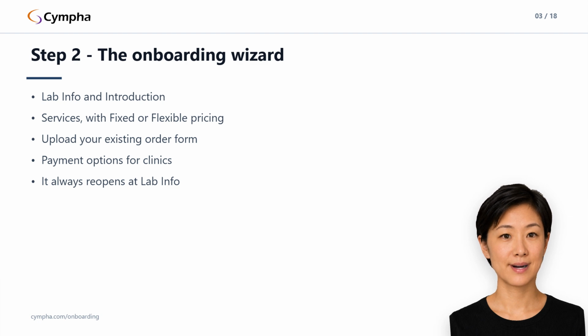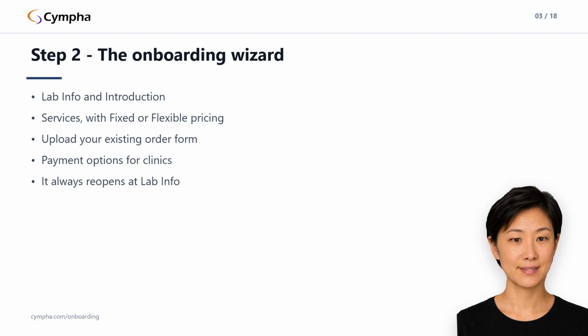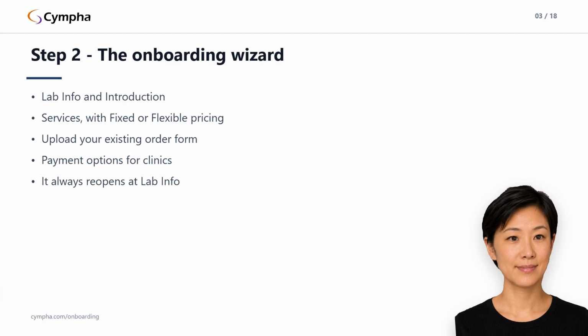Completing sign up makes you the owner of a brand new lab and the four-step onboarding wizard opens by itself. Registering the lab is free. What it costs to run cases through Cympha we will come to at the end, with the actual numbers.